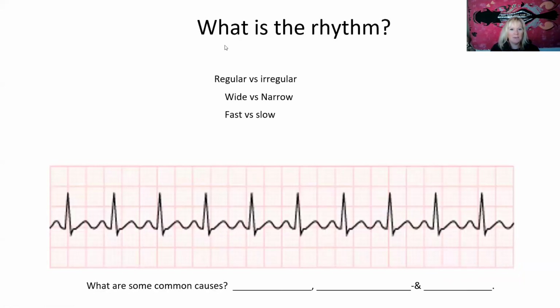So let's do this one. This is a fun one. What rhythm is this? What do you guys think? Sinus brady. Can sinus brady be much lower than 40? It can. Yep. Atrial flutter. Amy, good job. This is, I'm sorry, no, not this one. I'm thinking of the next one. This isn't a flutter. It looks like it is, but yes, Alyssa, this is sinus tach. Ilijana, you're here. And also Diksha, this is sinus tach.